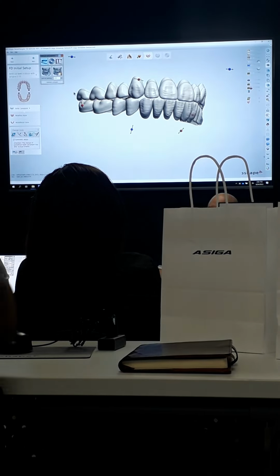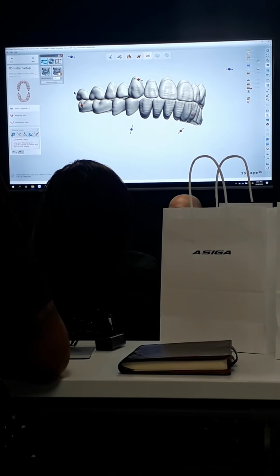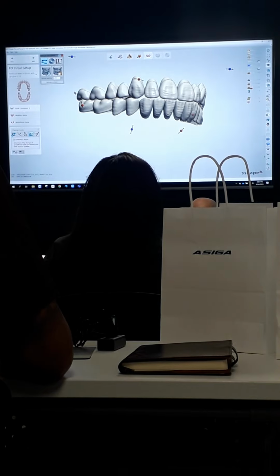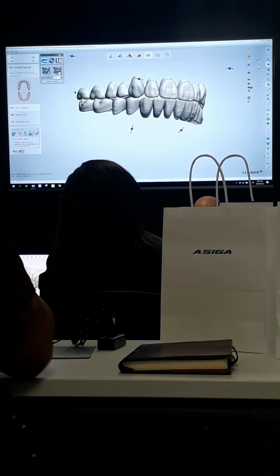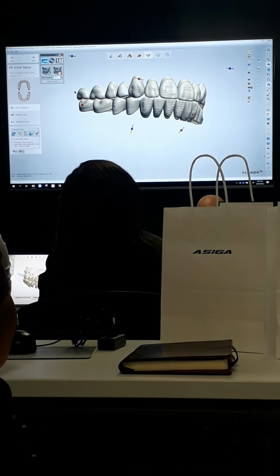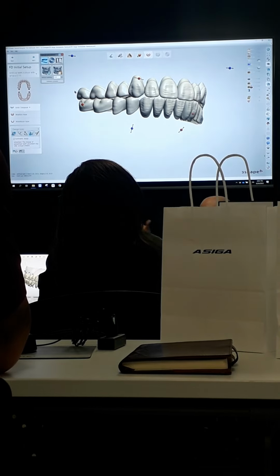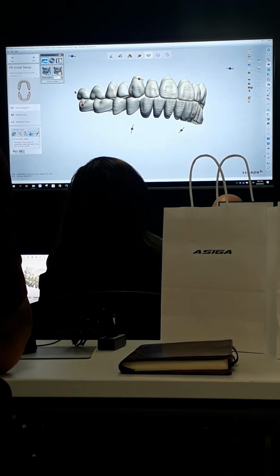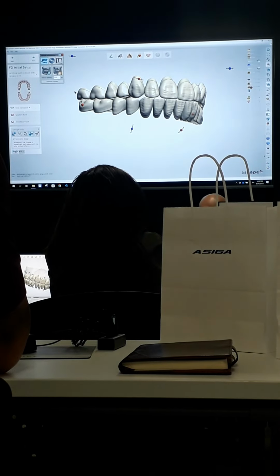The first one is the do not use tool. Don't ever go in here. This area does more damage to new users than any other function on this thing, so steer clear of that first icon. If you grab these and move them around and then lock it, it's locked for good. You can't go back to the original without creating a whole new case, re-importing scans, and starting from scratch. So always stay away from that particular icon.